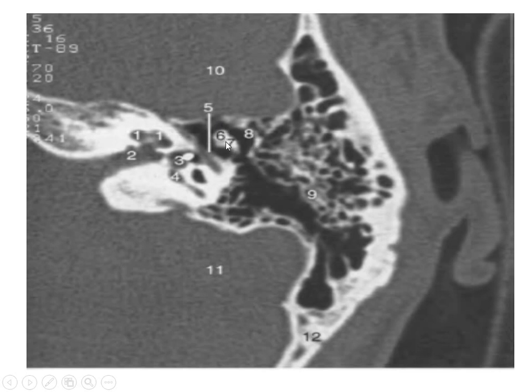This is the ossicles, malleus, with the ice cream cone appearance. It looks like an ice cream cone. You always look for that. This is the epitympanic recess, and this is the mastoid air cell. This is the aditus.